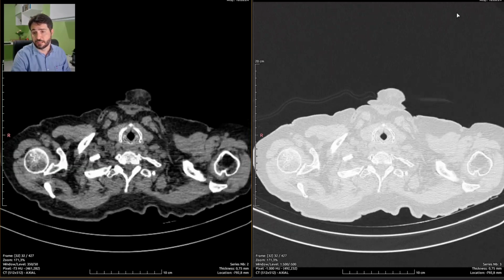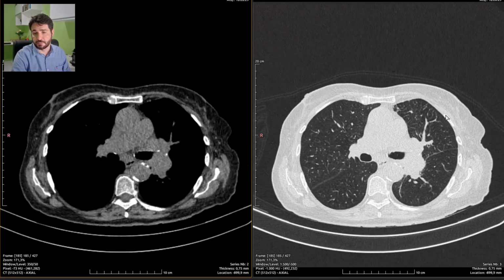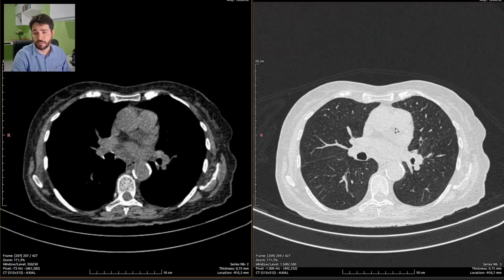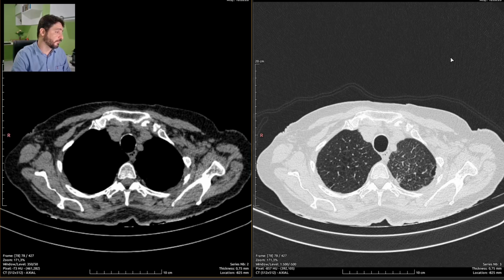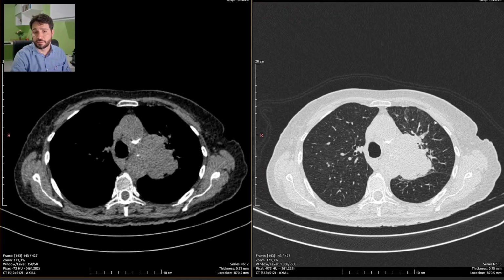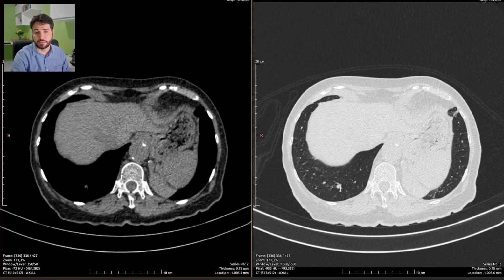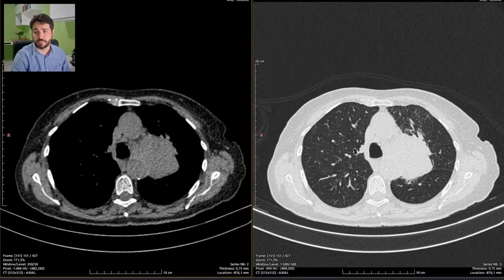This is a terminal case. This is a very, very serious case, an advanced disease case. I don't know why this patient doesn't have a diagnosis so far, because this is quite easy to look at in any simple chest x-ray, but still this patient has gone through surgery and a bunch of procedures and has gone through the emergency department, and still no one had noticed this humongous pulmonary cancer right here and a secondary lesion right here, which is kind of the same but a bit different, but should be the same presentation, another presentation of the same disease.